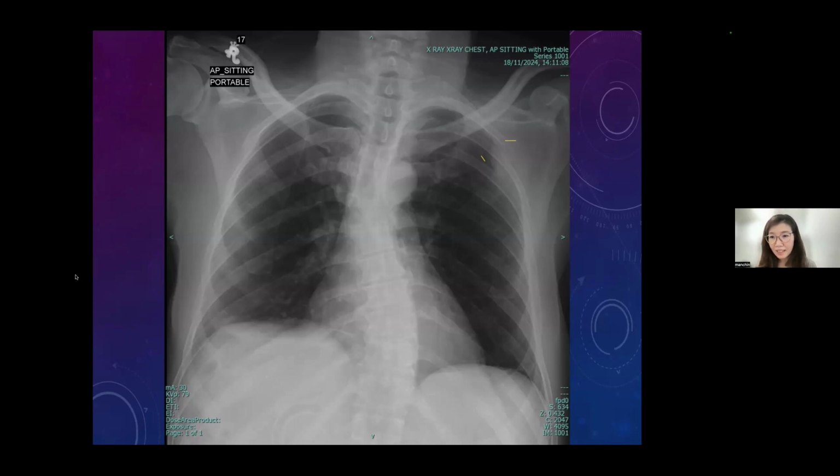Come on, guys. Left fifth rib fracture? Not a trauma case. There's no fracture. Okay, left fifth rib. Somebody already drew it, you see? Wow, good. Who drew it? Now erase that. Whoever drew it. Okay, thank you. Is that the fifth rib fracture? No, it's not the fifth, it's the fourth. Whoever drew it didn't answer, he just drew it, but he drew the correct one.